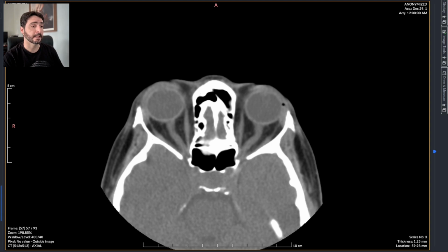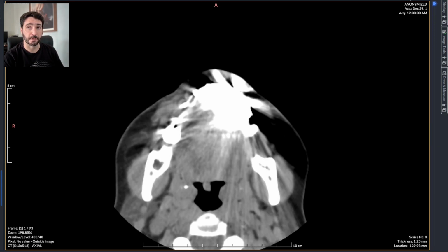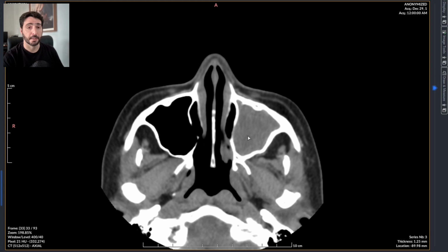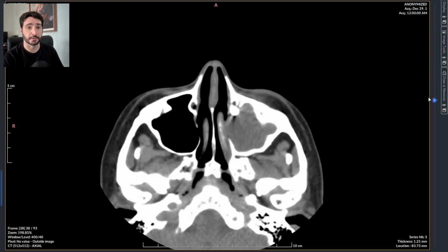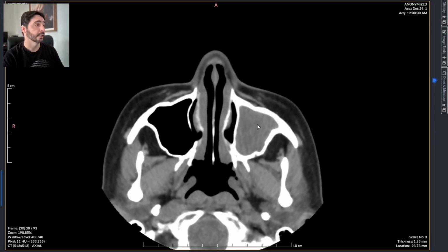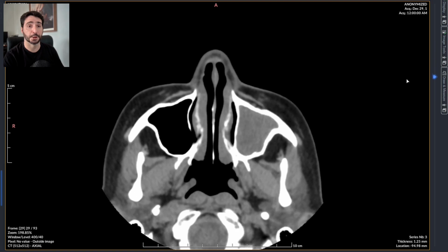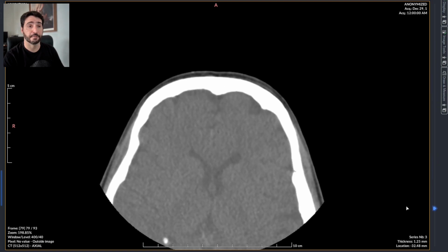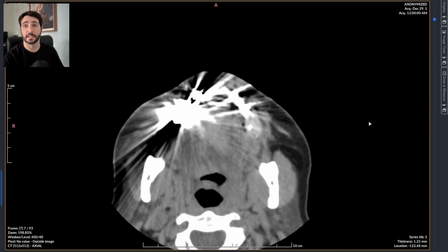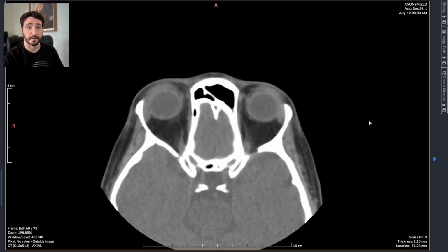We have, of course, a soft tissue window that we look for inflammation of soft tissue parts, and we can actually measure attenuation and look for calcifications of the components of a sinusitis, such as this one on the maxillary sinus to the left, right at the location where the patient said he felt pain and nasal discharge and all those horrid symptoms of chronic sinusitis.